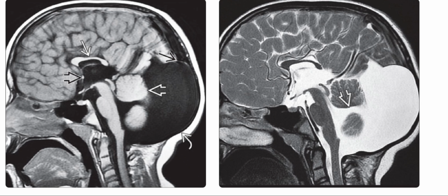The rostrum and splenium are absent. The anterior commissure is present and appears normal. On the right image, we can see that this is T2 weighted MRI, and it shows that the fourth ventricle is open dorsally, contiguous with the huge posterior fossa cyst.